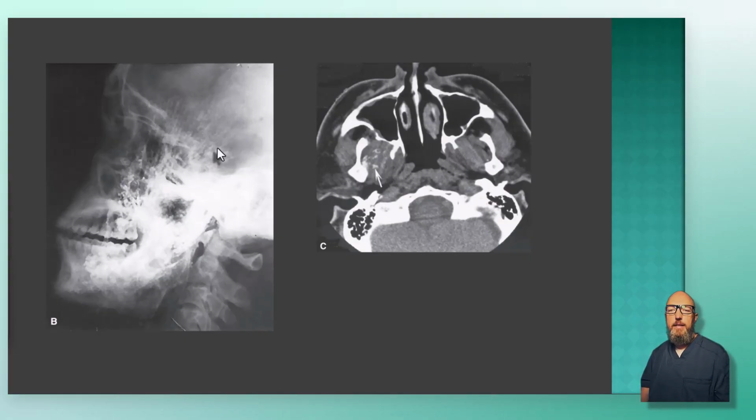First glance, you may say, oh okay, we talked about sun ray appearance, that's osteosarcoma. But if they don't have a huge tumor on the outside of their head, which for an osteosarcoma being this big, you'd probably see that. And they do have a problem with function likely. This is following striations of the temporalis muscle.